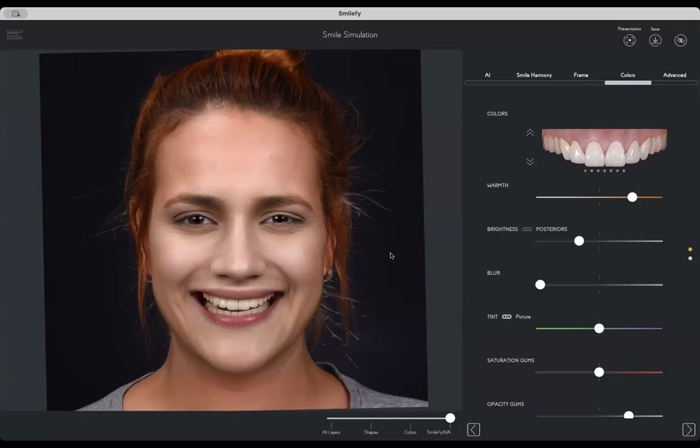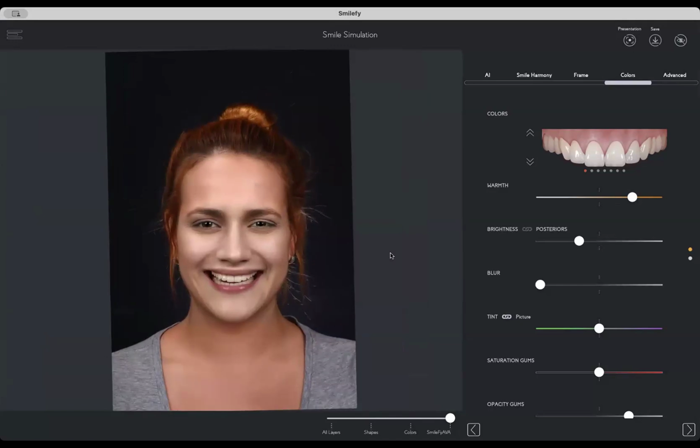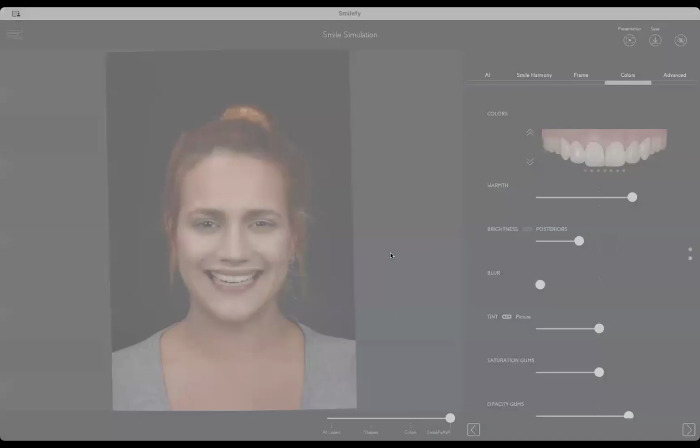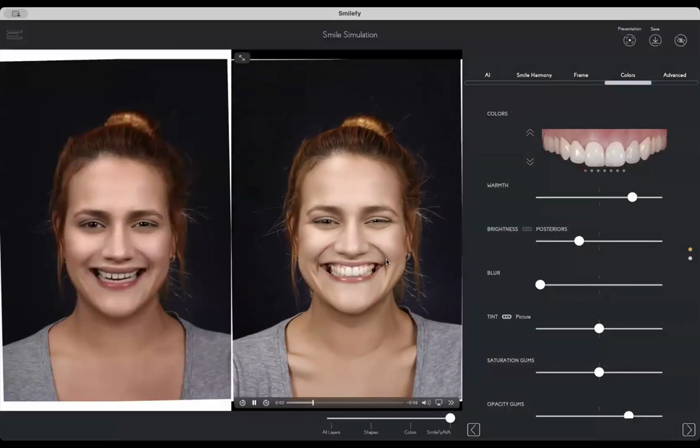With one or two designs, you can show your patient chairside in a few minutes a result of the simulation and open the discussion for the aesthetic treatment. Our video is ready, and here we go.